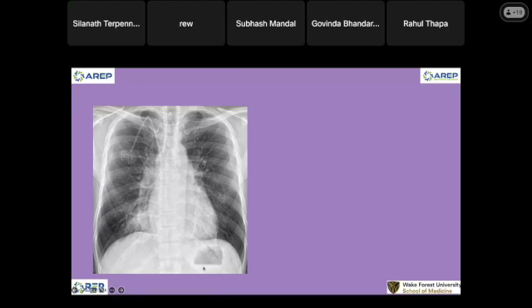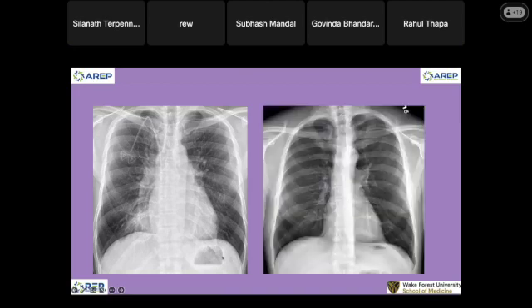Okay, no symptoms. So what do we see in this person? Big heart compared to a normal chest. Anything else? The trachea is shifting a little bit. Cardiomegaly. Does the mediastinum look okay to you?